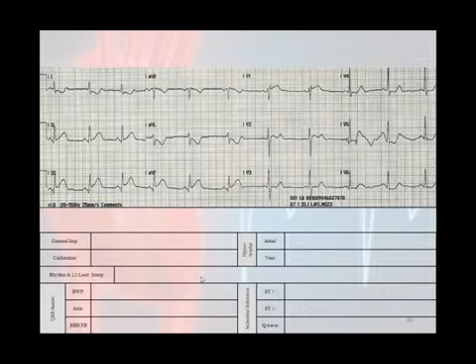Did you see anything that was excessively fast, excessively slow, or any ugly morphologies? Well, if you look at the rhythm, it doesn't look like you have any excessively fast or excessively slow rhythms, but it does look like we actually have some ugly morphologies. If you look over here, that looks like an ugly morphology. These look like ugly morphologies. This over here is actually maybe patient movement or something, so you can't really use that as a problem. But anyway, this does have some ugly morphologies.